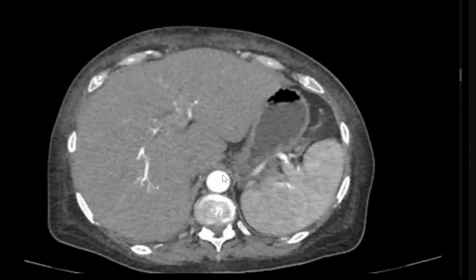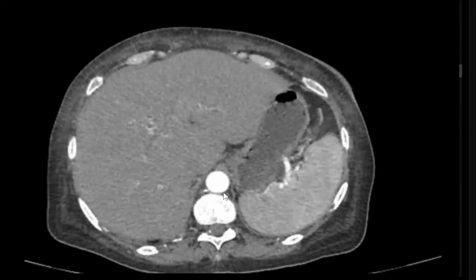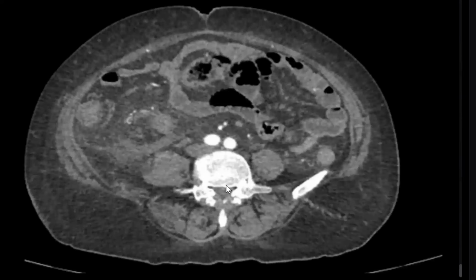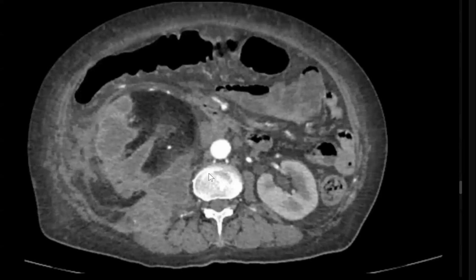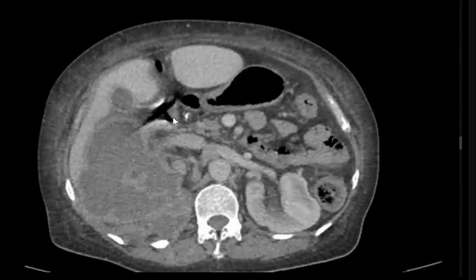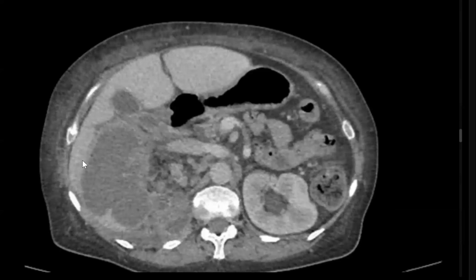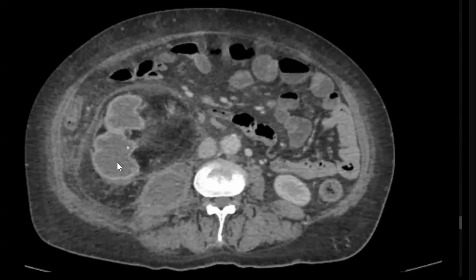The images are jumping. No problem. But is it right renal pathology or hepatic? I'm looking. It's actually right renal pathology. I'll give you a better phase. I think the portal. It's just adjacent to the liver. But what is the abnormality?